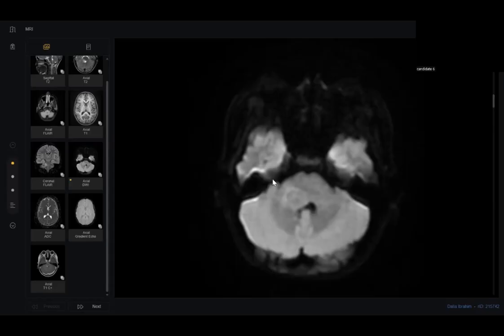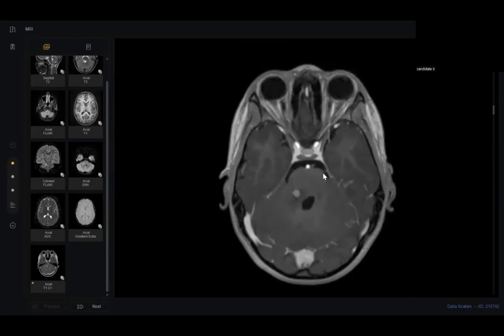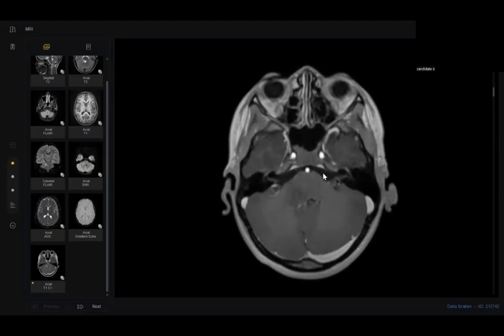So what's your final diagnosis? I think demyelinating plaque. What do you think, demyelinating plaque has this appearance of enhancement? Sir, active demyelinating plaques may show ring enhancement. Are you sure? Usually, sir, they have an open ring enhancement. This is not an open ring.